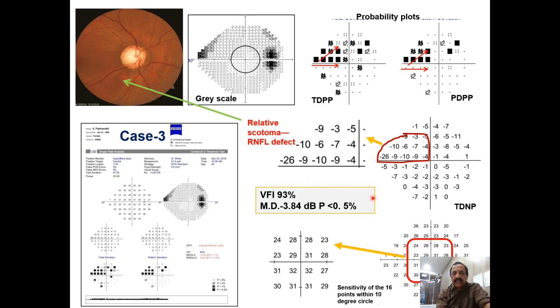Now look for the deep scotoma. The deep scotoma is at this point and progressing from here towards the center and away from the center. So the glaucoma started outside. Single drug therapy was put on, the patient is stable and followed till today.